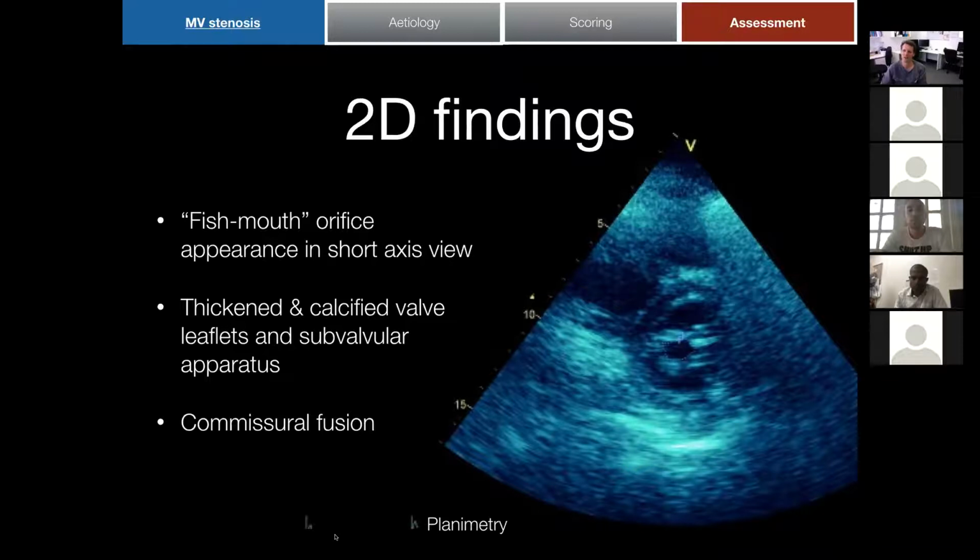Yeah, and I think that's probably more important when you talk about the vena contracta. That's going to be different where it's at the actual orifice size versus where the smallest point is. I think it's more important for the vena contracta, not so much with this. We're talking about the smallest orifice area size that we're trying to measure.